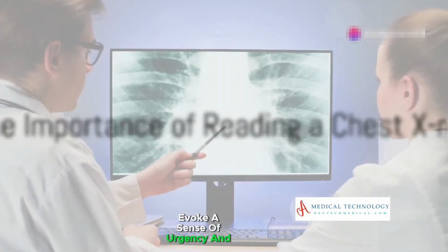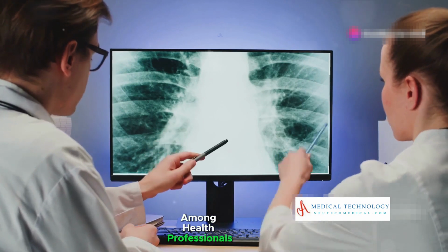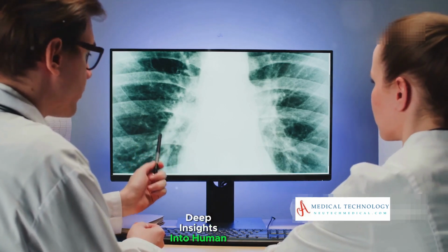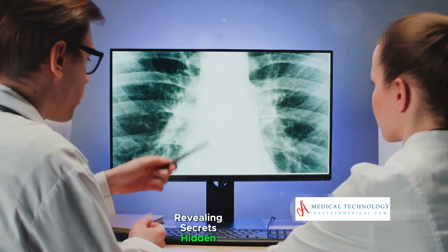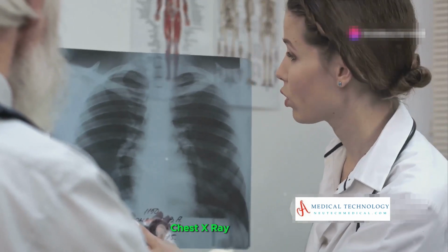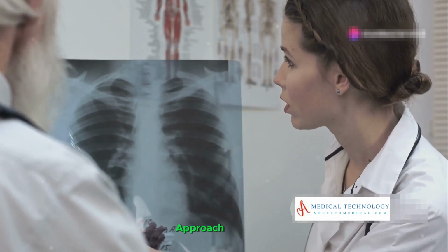Why does the mere mention of a chest X-ray evoke a sense of urgency and precision among health professionals? It's because this seemingly simple image harbors deep insights into human health, revealing secrets hidden within the thoracic cavity. To embark on the journey of reading a chest X-ray, begin with a systematic approach.